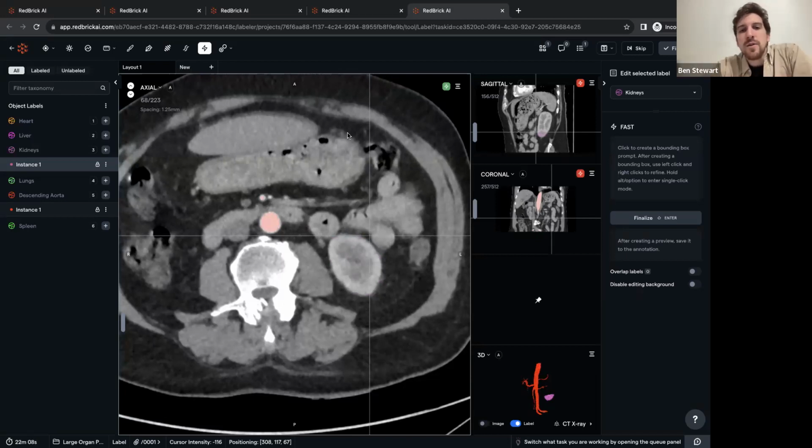Angela, do those tiny holes affect the QA of the annotation if not filled? That's an excellent question. Do they affect the QA of the annotation? I can say I've seen projects with clients where it does and does not, right? Some people are, for example, very concerned with boundary lines. They're very concerned with just the borders involved with a region of interest. And some people are really looking to have a volumetric measurement of a structure. So it's very much a case-by-case basis in terms of whether or not the tiny holes are going to affect it.